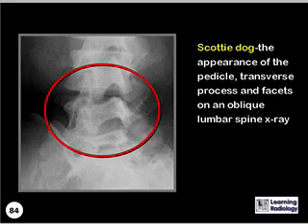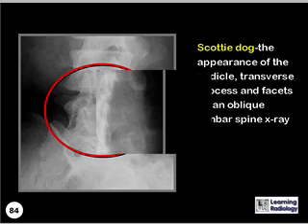That's the famous Scotty dog, the appearance of the pedicle, transverse process, and facets on an oblique lumbar spine X-ray. What is this sign called?